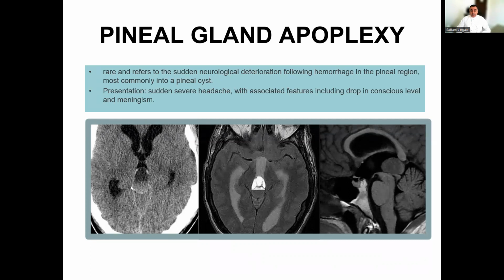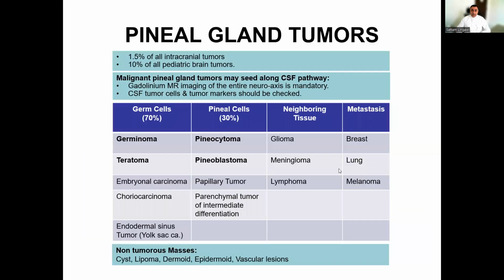This is a large pineal gland cyst with blood debris within its posterior aspect. You can see here the blood fluid level and the multiple septations within the cyst itself, as it is also demonstrated on these T1 weighted images with higher proteinaceous content within the cyst itself and the blood debris in the posterior aspect of the cyst, in a dependent part of the cyst.